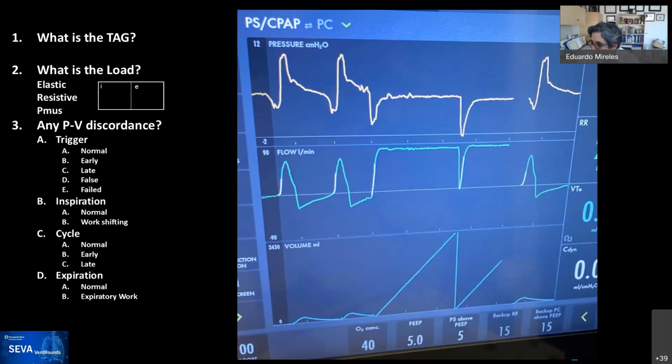I can try. I think I need more time to figure out what's happening here, but I'm gonna try and do it on the fly. Go in order. That's the beauty about this. We go in order, and you'll see. You'll get it. There is no doubt in my mind.